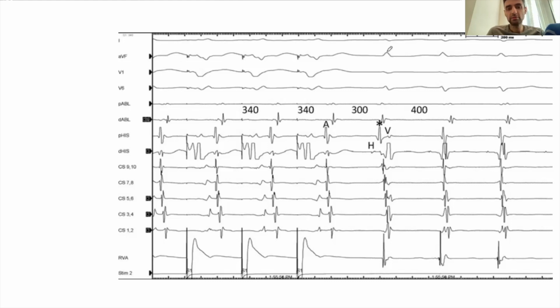Okay, further examples. So you are V pacing here, okay? You're V pacing at 340. You're accelerating the A to A cycle length at 340 as well. You see here this is your V, this is your A that came in at 340. So you know this is your last A. So there's V, A, but then sometimes the next thing that comes is VA at the same time. Okay, so that's confusing. Is it a VAAV response or a VAV response? It's difficult to tell.